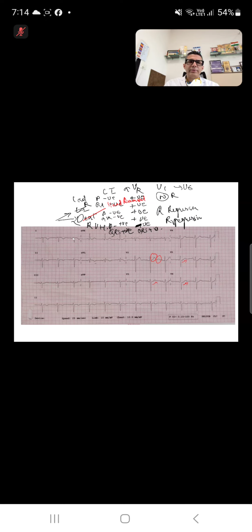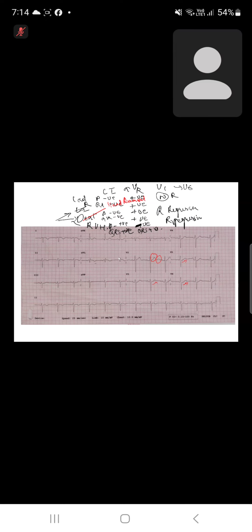Sir, you want to add anything? Actually, the ECG is not only lead reversal, but everything is badly done. But anyway, imagine this patient has a left axis. The pattern of left axis or left anterior block can explain the poor R wave progression as well as the appearance in chest leads also. Left anterior block can have that pattern.